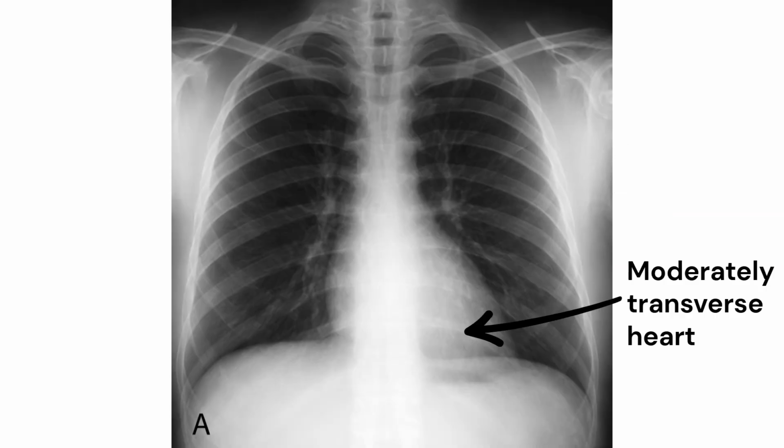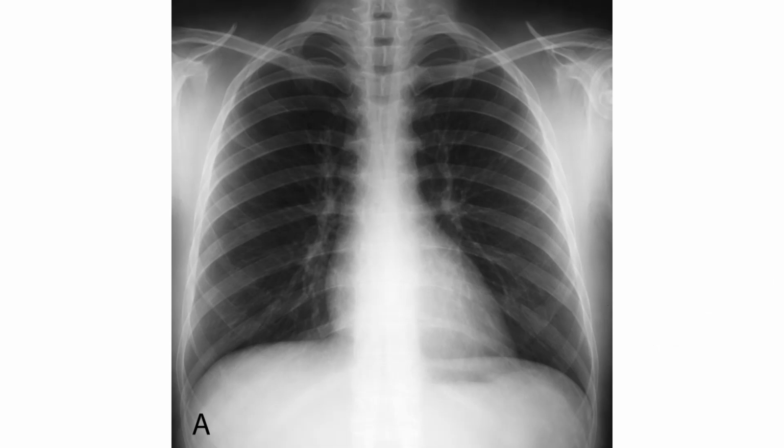Because sthenic patients approximate the standard anatomical model, imaging interpretation is often more straightforward. However, it is important not to assume that this pattern applies to every patient. In practice, many patients fall somewhere between sthenic and adjacent habitus types.